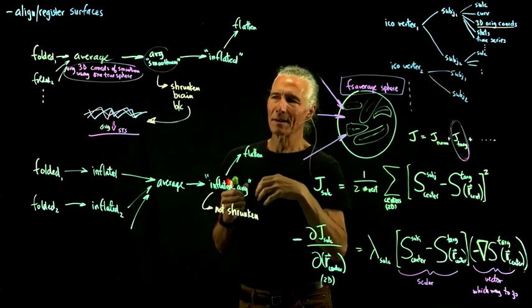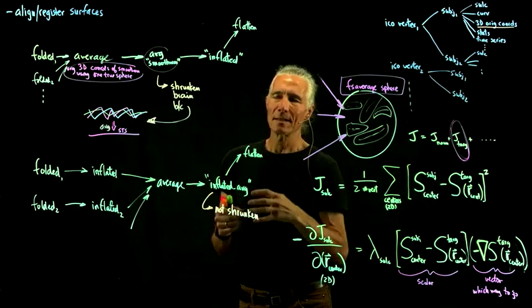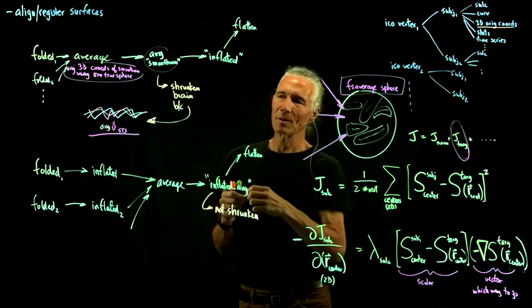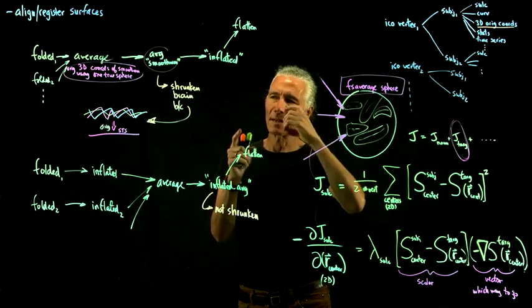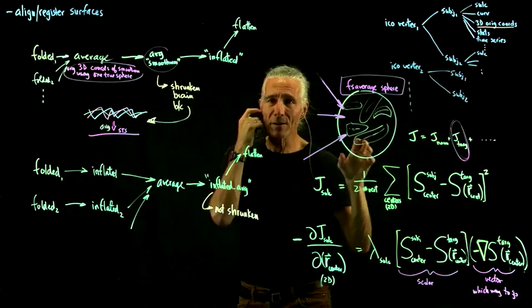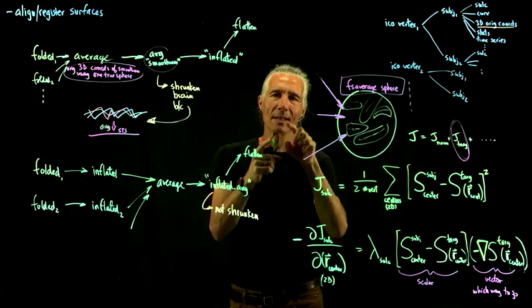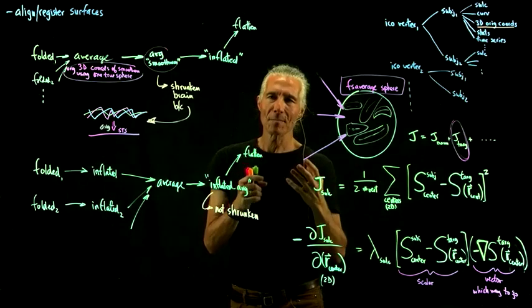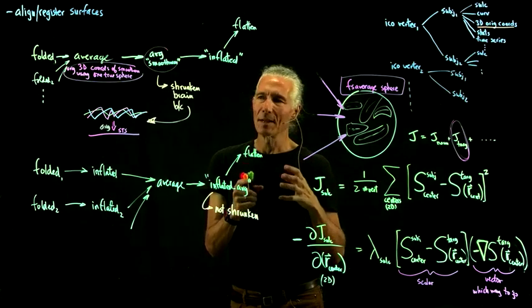Then take the data, average it in 3D, calculate statistics, or take the data, do inflation and sphering, then registering on the sphere, and average the data that way. You can see that you have a lot less variance in the borders of something like area V1 if you've done everything on the surface instead of doing it in 3D.